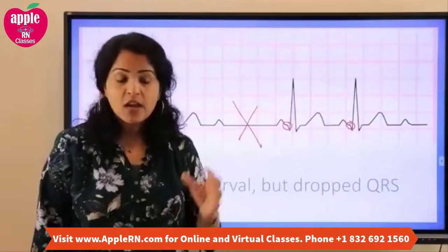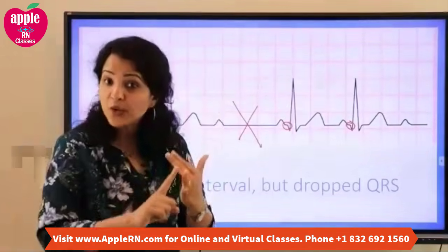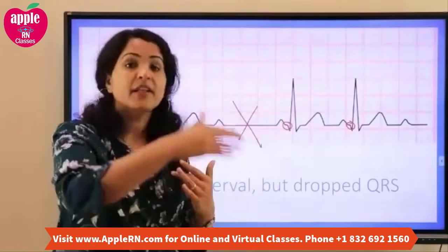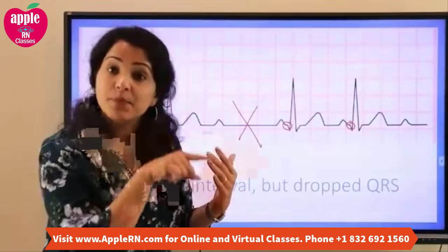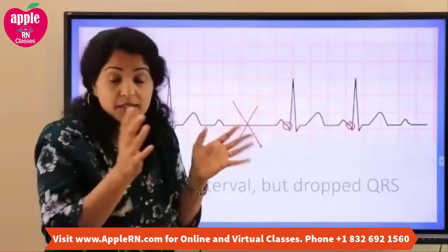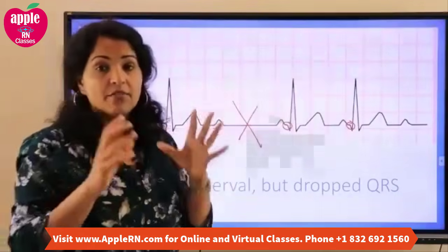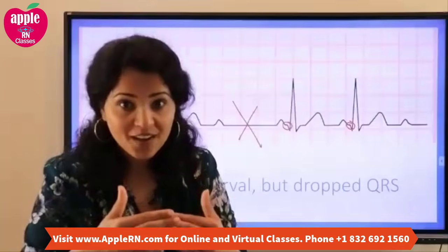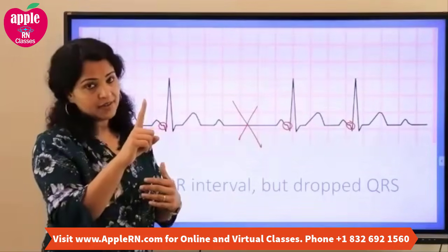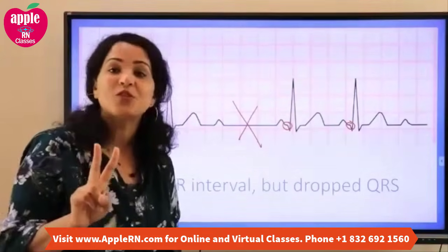How do we identify? Always look at the ECG and see if there is a P and QRS for each beat. If there is a P and QRS for each beat, then that is good. Then look at the PR interval. If there is a P and QRS, but the PR interval is longer, that is first degree. Now, if there is a QRS dropping, then it's second degree. In second degree, if the PR interval is getting longer and longer and longer before it drops, then it's type 1. If there is no change in PR interval, but suddenly it drops, then it's going to be type 2. Okay?